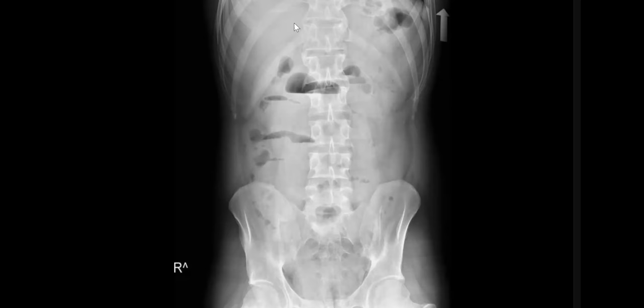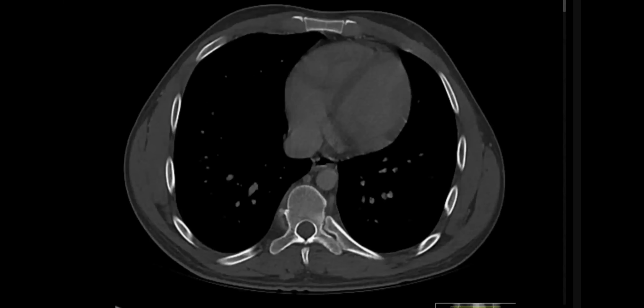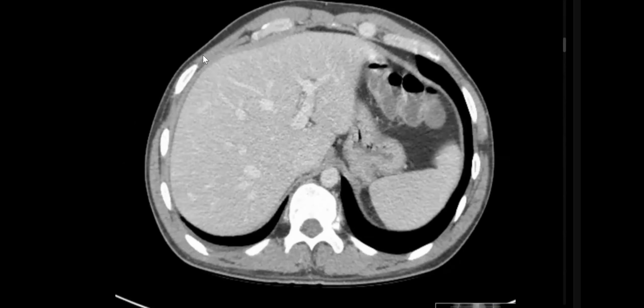Very good. So we comment on the liver, any branching lucency. Also, it may be secondary to ischemic bowel. Again, no portal venous gas, no branching lucency overlying the liver. It could be pneumobilia, could be portal venous gas. Surgical clips, radio opaque shadow, as in gallstone ileus, and others. I'll give you a CT scan because others are present already in the radiograph, but we will cover it later on.